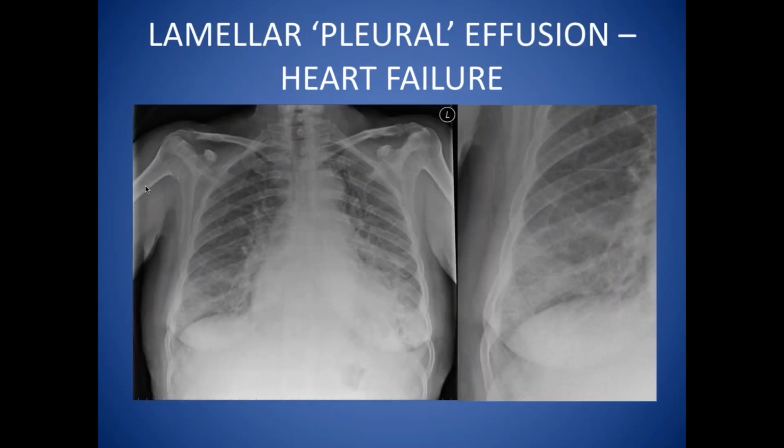If you ever see a lamellar pleural effusion, this is virtually pathognomonic of heart failure. So this is fluid that gets trapped between the lung and the visceral pleura and is a very potent sign of heart failure.